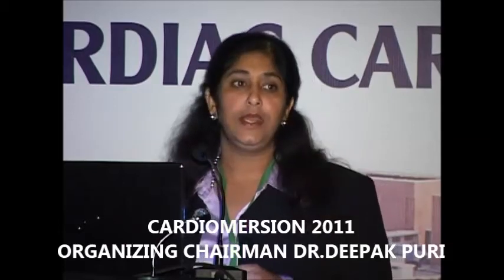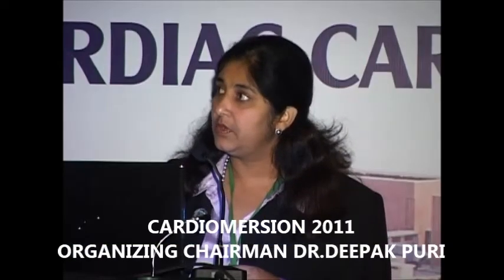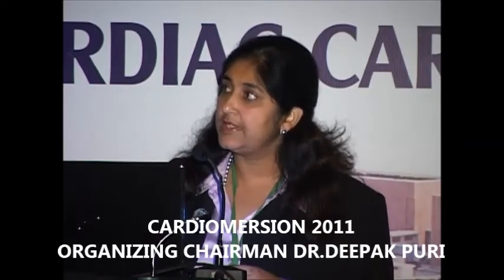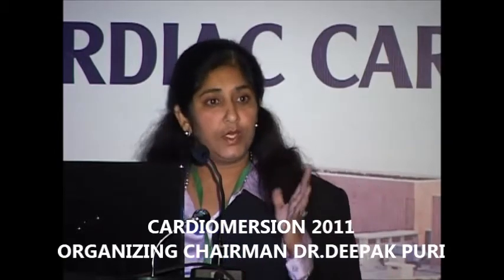We had done a CT because this patient was diabetic, and so we could not give her contrast. She had come with some pain in the back of her chest, and people were actually thinking more of a thoracic spinal cause for her pain. But lo and behold, we found that her descending thoracic aorta, as you can see, is dilated, and you can also see a dissection flap on the non-contrast CT.